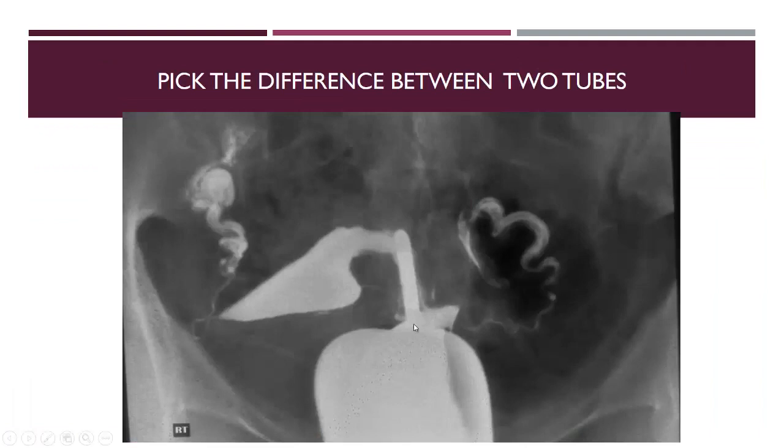What is the difference in this case? Here the uterus is in an abnormal position because there is no traction on it by the stick. But regarding the fallopian tubes, this tube appears with normal mucosa and normal caliber. The course, some of you will say, is a vertical course, but it is not a vertical course. It is due to the abnormal position of the uterus.